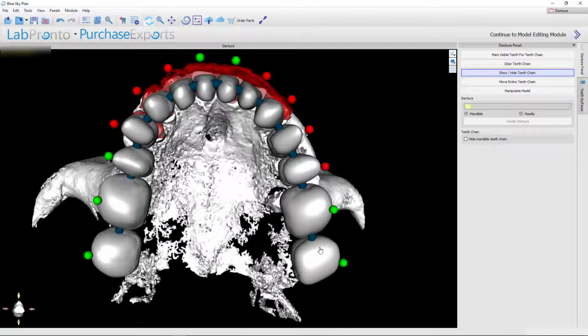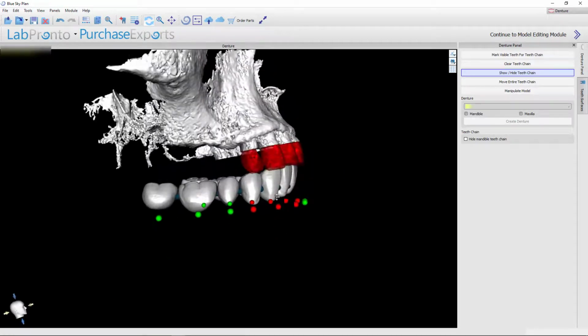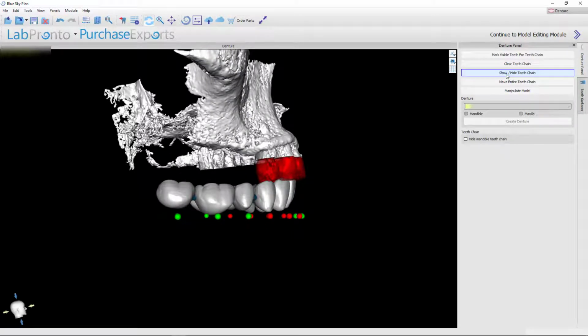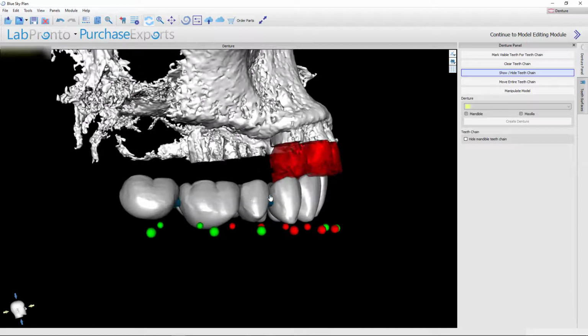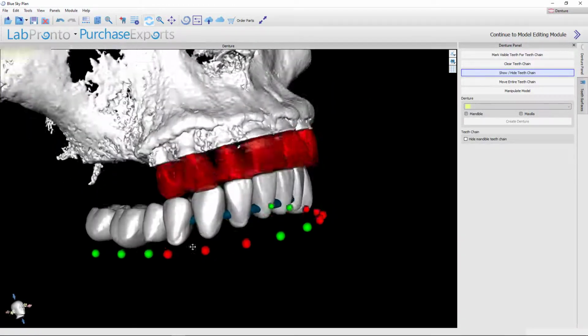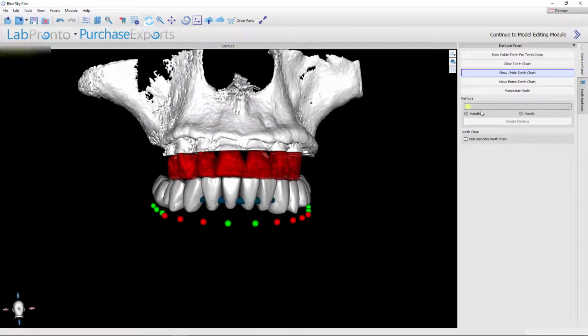Okay, right there. And I'd like to visualize how far back her arch is, because one thing I haven't accounted for is the tooth scaling. I'm thinking first premolar, first molar, with this tooth residing right there in the mesiobuccal cusp, and really I don't think I need to change the scaling. Okay, so there we go. That's my entire setup. So now I can begin planning implants based on that.